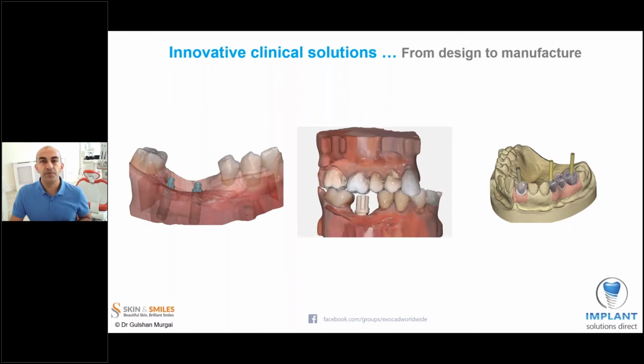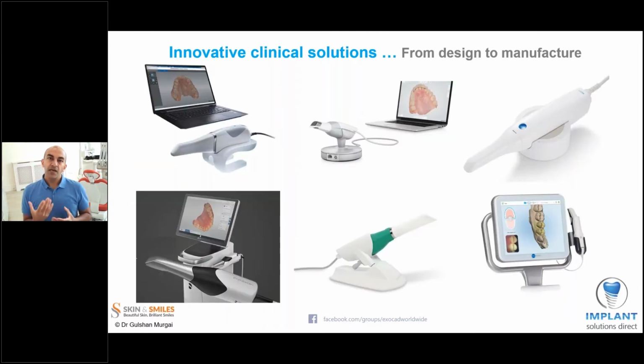We've now got here up on the screen an implant planned case where a patient has been scanned with scan bodies, and then you can design a screw retained or cemented restoration. Now, I've already mentioned that exocad is an open platform, and here you can see a host of different intraoral scanners, and all of these intraoral scanners can produce an open STL file. As long as you can generate an open STL file, you can use exocad for ChairsideCAD design.